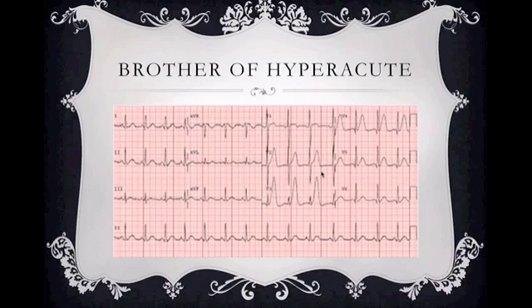All right, so here's that last EKG's brother. What do we got? We see very big. Look at the size of this hyperacute T wave in relation to this R wave. That is too big and too wide to be a hyper K T wave. It's not pointy, it's rounded, with a very wide base. We don't want to see that. That is a hyperacute T wave. You can't look at that and say that is a hyper K type T wave. But this is huge. We have no R wave progression. Rounded top, very wide base, huge T wave in relation to the R wave. This is a hyperacute T wave of a massive anterior wall MI.